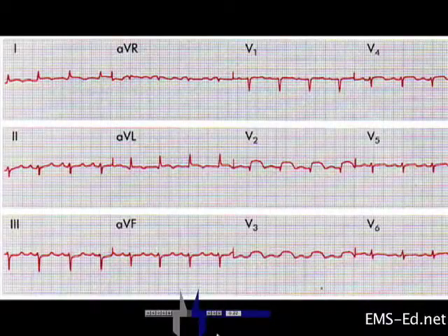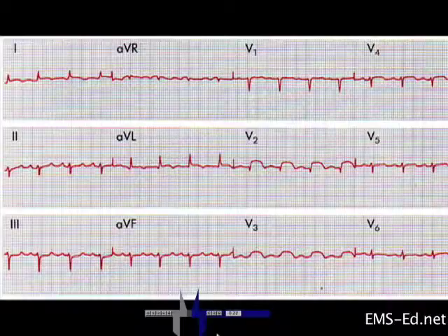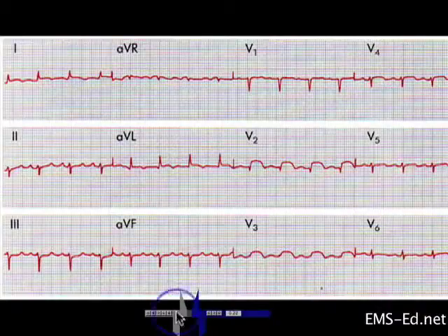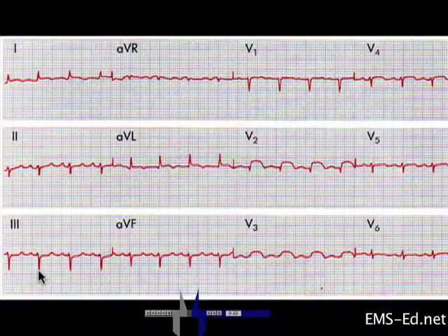For this episode, we consider a 70-year-old female who is hemodynamically stable and presents with syncopal episodes. This is her EKG. Let's be systematic in our approach and begin with the rate. Let's use the pointy R waves as our marks for measuring the interval between complexes.